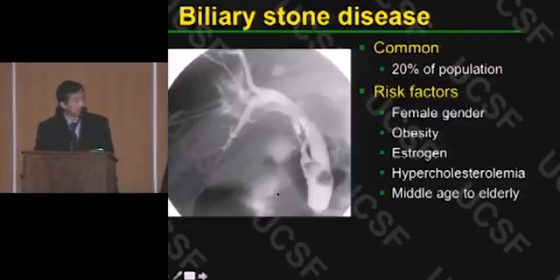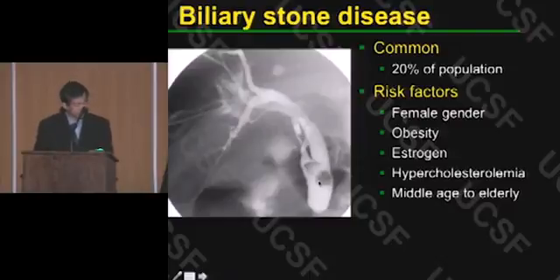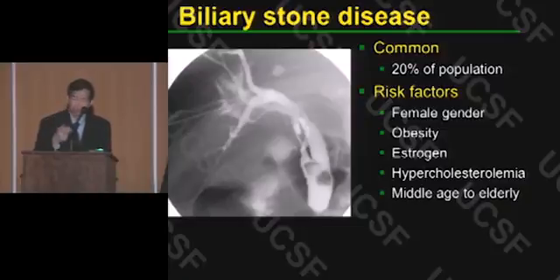This image is of a fluoroscopic percutaneous transhepatic biliary injection of the bile ducts. And we can see two stones here, and they illustrate the typical appearances of stones. Usually there's some bile duct dilatation upstream, but not always. The stones are usually stacked close to each other, one on top of the other, and they're often faceted. They often have a geometric appearance rather than being perfectly smooth and round. Also, they often lay asymmetrically in the bile duct, in the most dependent portion of the bile duct. So these are helpful clues that we'll come back to as we look at stones.